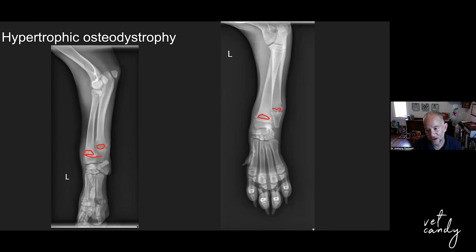In these guys, there's often soft tissue swelling. And guess what? There is soft tissue swelling right there. Okay. So it's a disease of the immature skeleton, large, fast-moving dogs. It can cause angular limb deformity. They oftentimes present with fevers, and they're feeling just systemically ill. We treat them supportively, and hopefully it goes away, without problems to the physis long term.